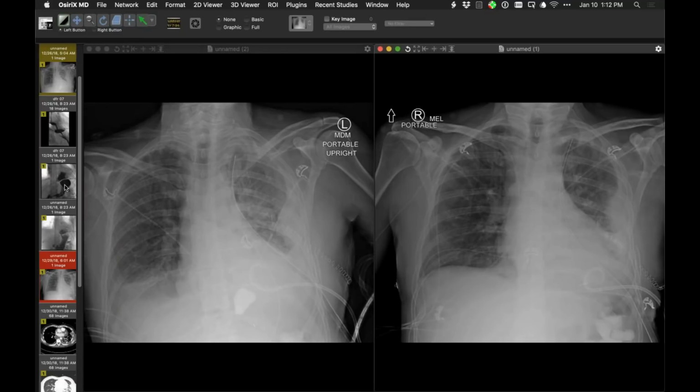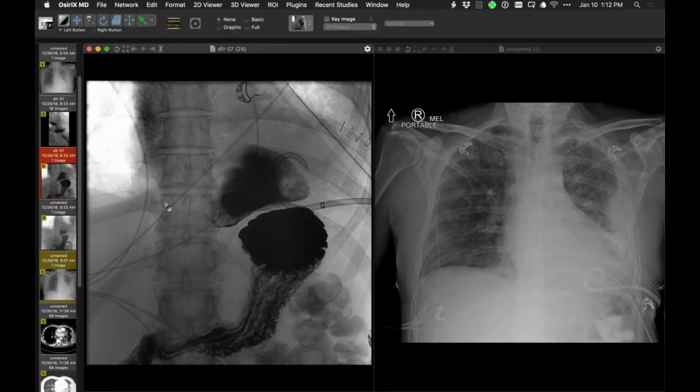I will tell you that there was a suspicion, based on a CT exam in which a small amount of contrast medium was seen in the pleural space, that the patient had a fistula between the dilated esophagus in the chest and the pleura. She had a contrast study initially to evaluate that, and they did not see a leak between the dilated esophagus, achalasia, and the pleural space. But because there was still a strong suspicion, she went on to endoscopy. On endoscopy, they did find a hole. The hole was plugged up with, as they described it, food at the time, but they did find the hole.